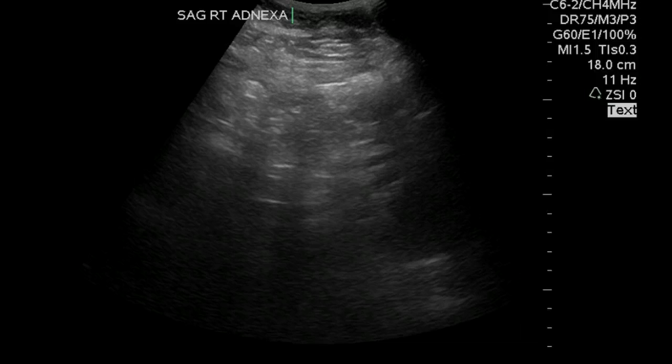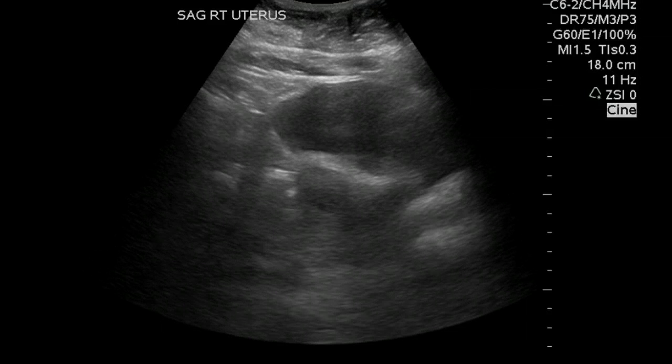The history was a patient with previous endometrial hyperplasia and previous history of breast cancer. To my knowledge, the patient is not on any current hormonal therapy, but that history, of course, was not given, as it often isn't. It can be important, but in this case, we're just going to read it as if the patient is not on hormonal therapy.